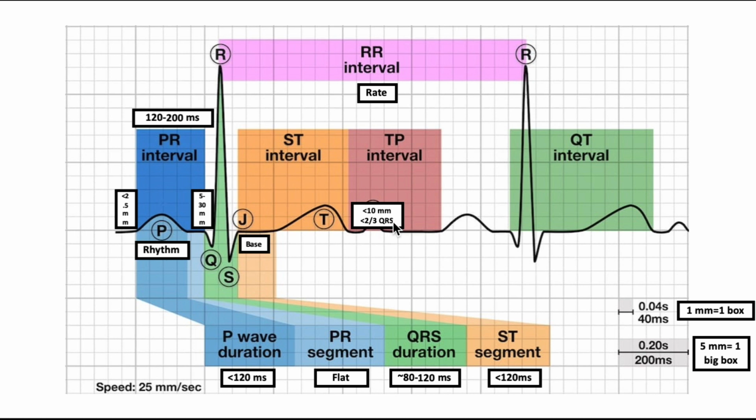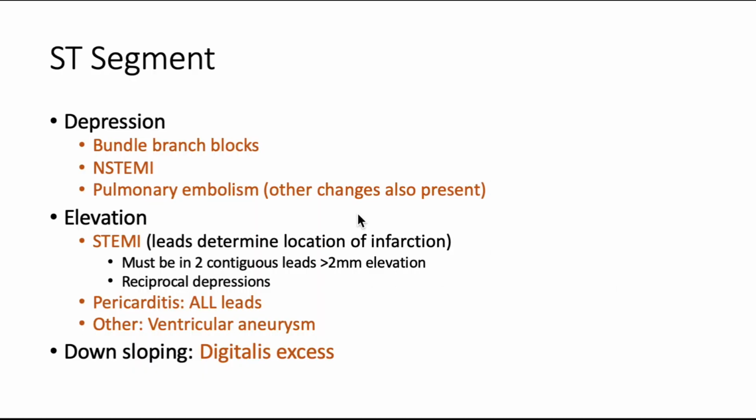Now I've covered up the U wave here because you really don't need to pay attention to that. It's not going to help you a lot. It's not really high yield.